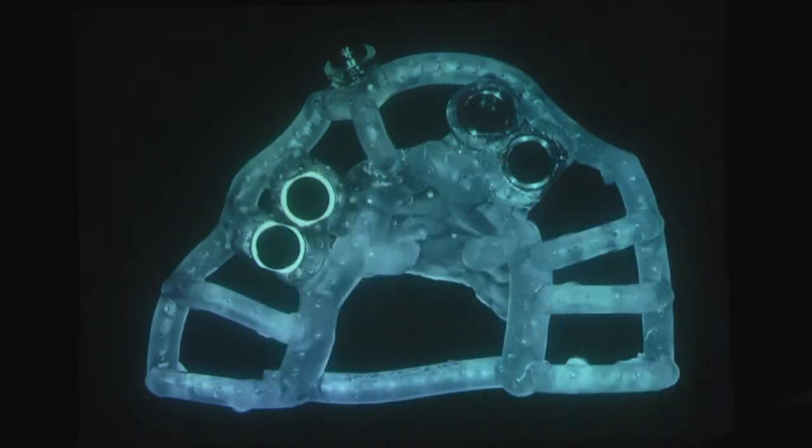There are so many teeth in the mouth, so we have so many reference points. So it is very, very easy for us to create a customized guide, and when we have the guide, it is easy for us to adjust it on the teeth. So many clamps, so many bridges, so many reference points. That's the thing we are looking for.